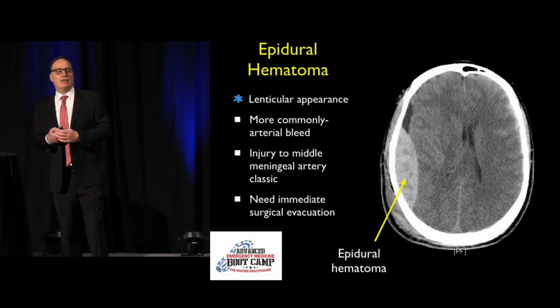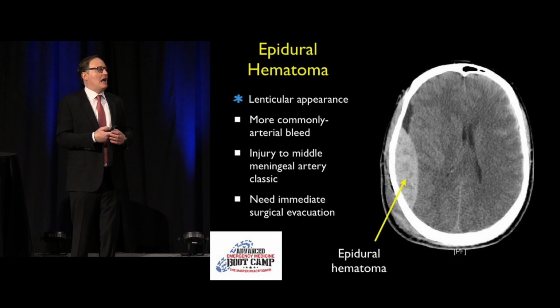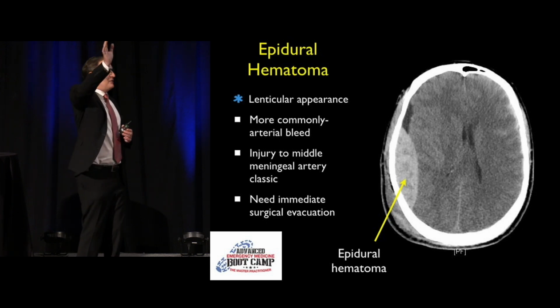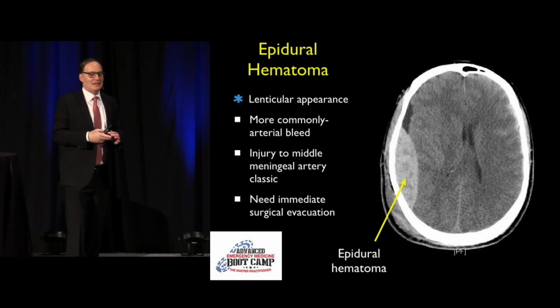This is an epidural hematoma, which is very different than a subdural hematoma. Subdural hematomas you're going to tend to see all the time in trauma centers. How many of you have seen an epidural hematoma come into your emergency department? A few in the back? Anyone on this side? A few? Pretty rare though, right? When you're looking at them, you're like, what is that thing? Is that a big subdural, or what exactly is it?